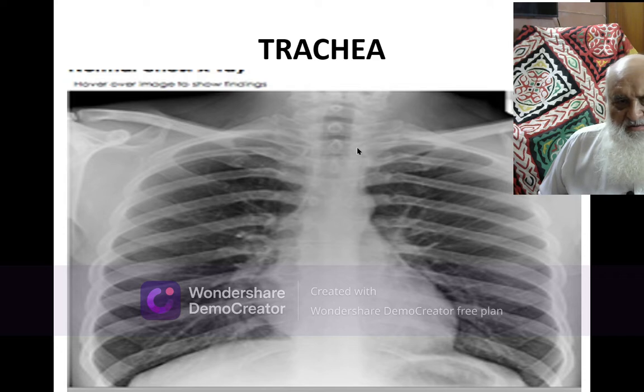Or secondly, it can be displaced to the same side because of contractures or cicatrization from fibrosis. It can be displaced to the other side by pressure forces like a very huge pleural effusion, or a spontaneous pneumothorax on that side. And the third is a tumor, which can displace it.